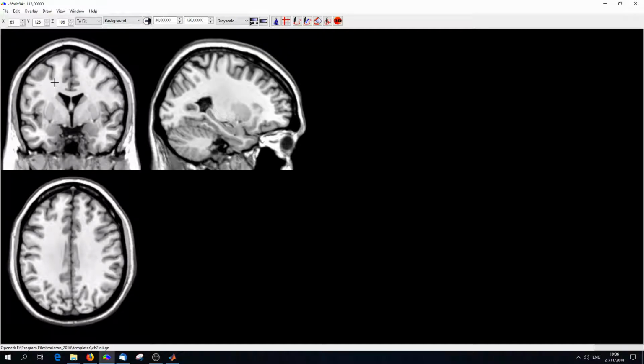So you see, behind these grayscale values in this image, there are numbers. And that's all a brain image is. It is a huge collection of numbers in a certain coordinate system, and the coordinate system can be transferred to a matrix, a structure with 3 dimensions in this case that contains numbers.